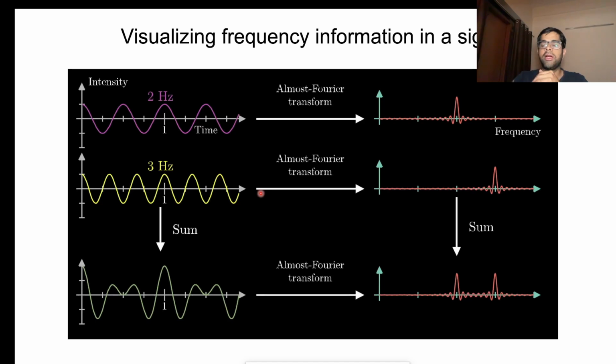For example, alpha waves are known to be a sign of when you just relax or close your eyes. So you can also tell when a person is sleeping just by looking at their alpha profile in the time and frequency. So there are other doubts which say, why are you using Fourier and frequency terms interchangeably?